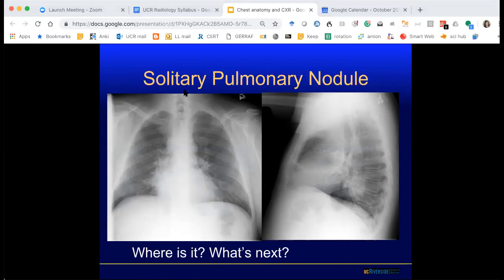Typically, the superior margin of the image is the cranial, and the inferior margin of the image is caudal. That's the standard. Here it's obvious because you can see the patient's anatomy, but on ultrasound, for example, the superior margin always has to be the cranial, and then the reverse for the inferior margin, and that's the typical standard.